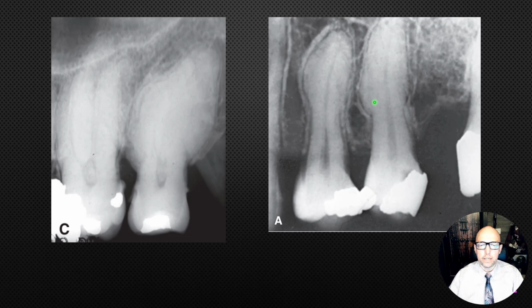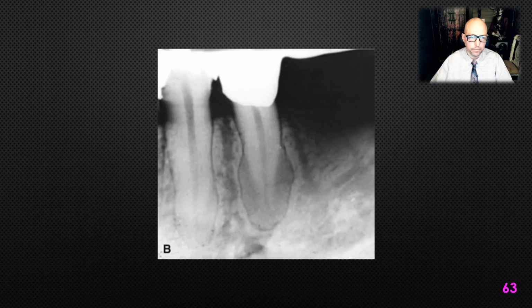This is your more typical appearance of hypercementosis. You see it a lot of times on the premolars, where the root just looks widened throughout the apical segment. PDL space, again, nice and uniform, nice intact lamina dura around it. Same with that premolar. And another example now of mandibular premolars. The cementum is just widened around the tooth. For this one, the cementum tends to look a little bit more radiolucent, but look at the PDL space. It's very uniform going around these lesions.